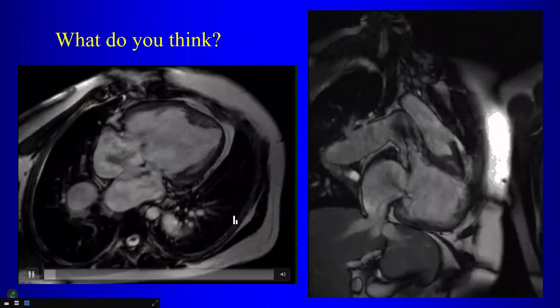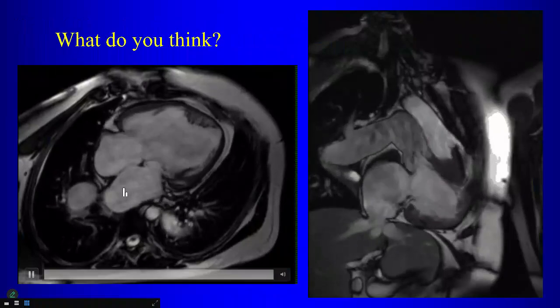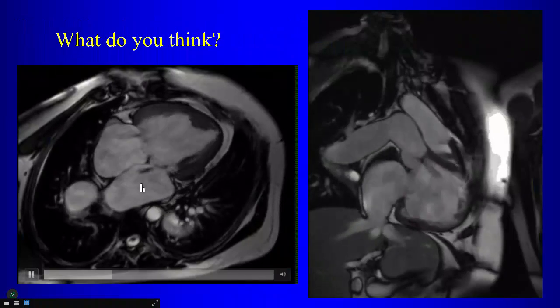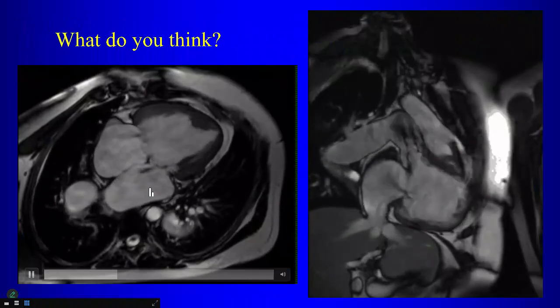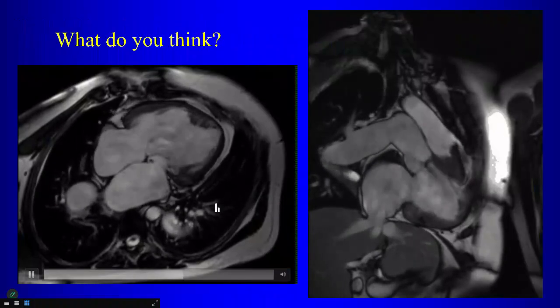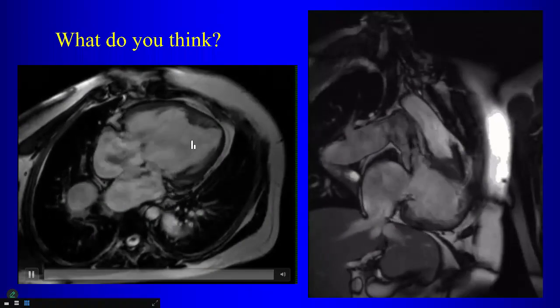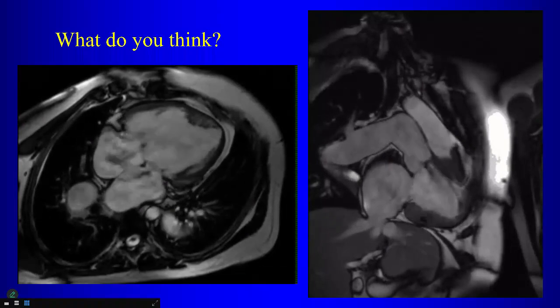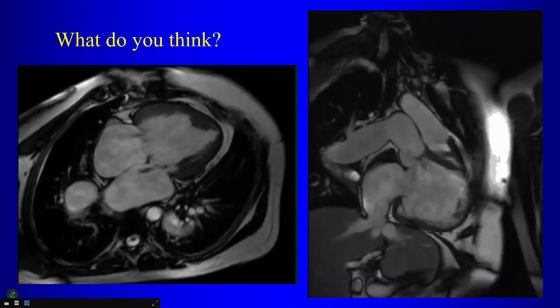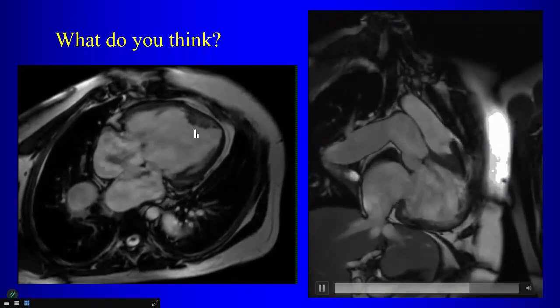Okay, so here's our next case. So this guy is left atrium, this guy is right atrium, right? But both of them are emptying into what? The common ventricle. Yeah, so what do we call this condition then? How many ventricles do you see? One, so what do we call it? Single ventricle, right? So it's also called a double inlet ventricle, so that's single ventricle.